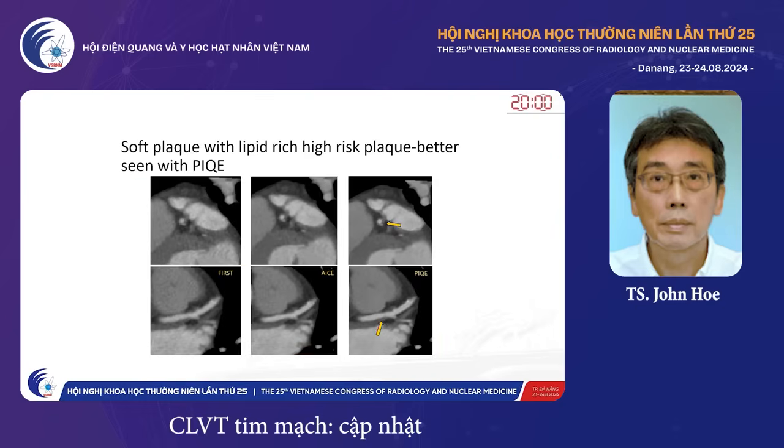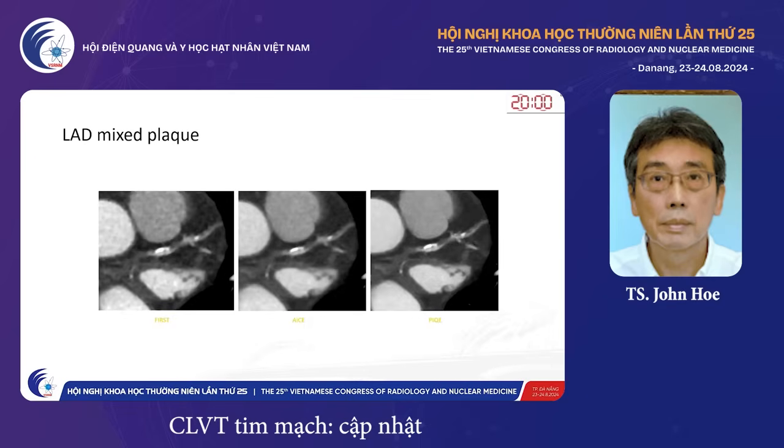Here's an example showing image quality, and you can see with this software, you can see plaque so much clearer than with the software that we were using previously. Here's a mixed plaque. Again, you can see the images are much sharper and there's better definition.